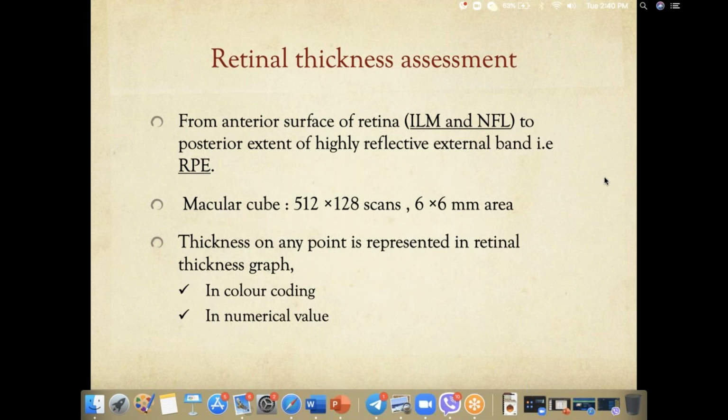Yeah, I definitely agree with you. But we can't just be focusing on the foveal center, because in this kind of disease you have to look at the macula as a whole, and the inflammation is not just limited to the foveal center. We have that tendency, especially when we are in the learning phase, to focus on the macular thickness, which is basically the foveal thickness, and we tend to overlook the other parts of the macula, which are equally important. And I definitely agree with you.